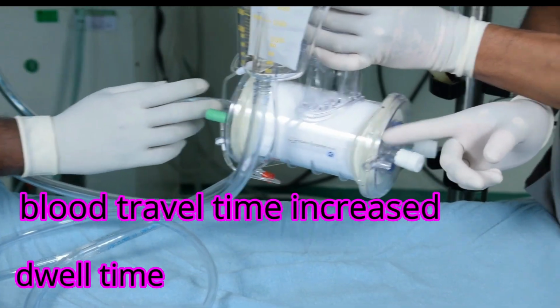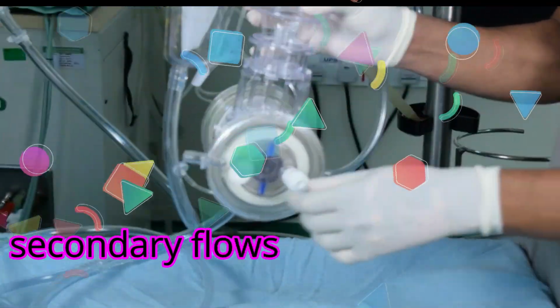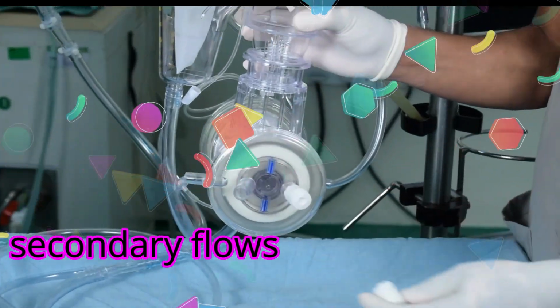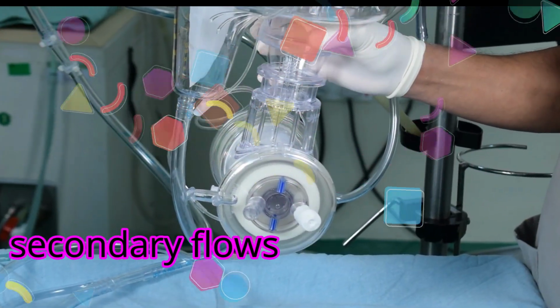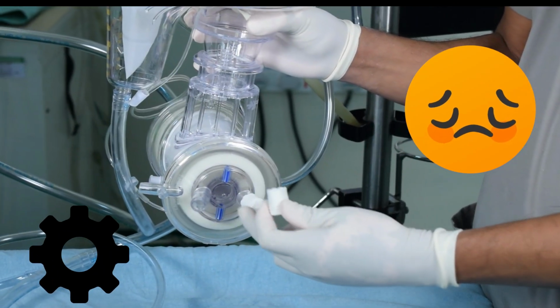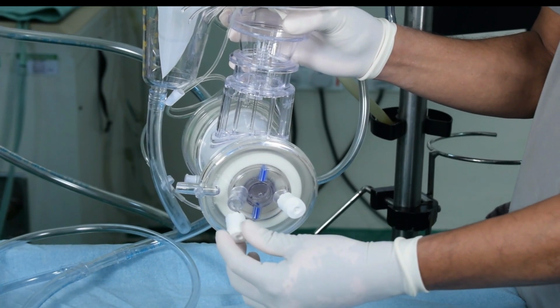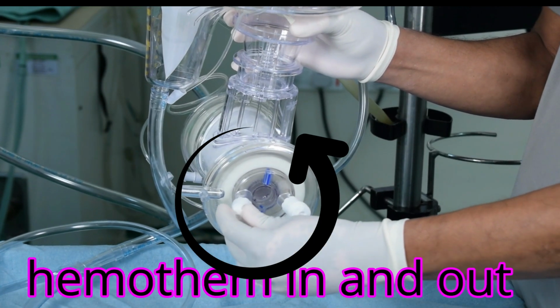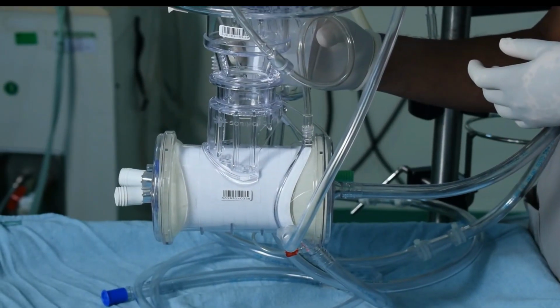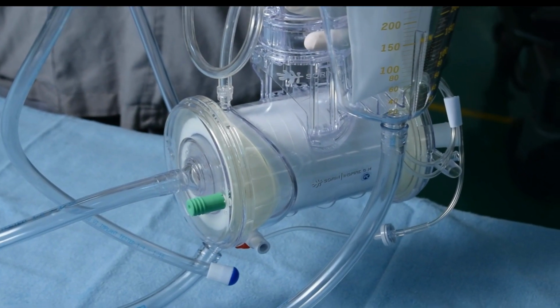A phenomenon called secondary flows are induced within these oxygenators to promote mixing and bring deoxygenated blood closer to the blood-gas exchange surface. Now, none of the oxygenators in the market can ever match a natural lung, but the hypothermia, the muscle paralysis and anesthesia that the patient is subjected to will reduce the patient's metabolic requirements to the extent that the oxygenator is sufficient to perform its job.